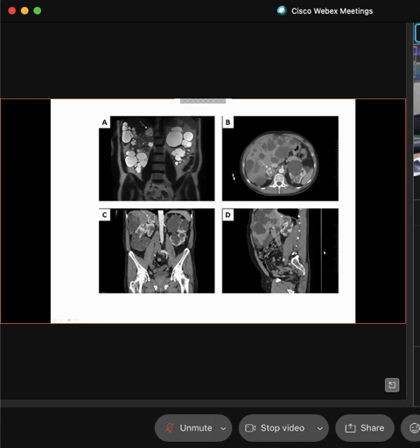Okay, now D. Tell me what kind of projection is D? What kind of cross-sectional image is D? Right, sagittal. We see the anterior and we see the posterior, but we do not see the left and the right. So the patient was sliced sagittally to obtain this image, separating the left from the right. Does anyone have any questions about what we just went over?